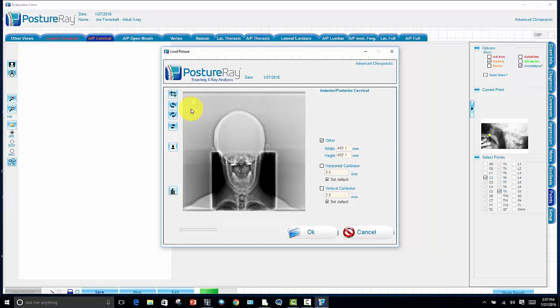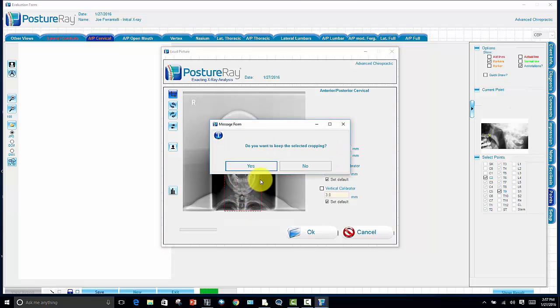There's more things to think of than what we were trained in chiropractic college, especially marketing and interpersonal relationships with medical providers and stimulating referrals. There's absolutely some good reasons why we're going to look at them like medical doctors here. So don't get confused. We can always flip out the x-rays when we put them into your EHR. When you save them out, you can be flipped back to the chiropractic view. But for the reports, we're going to want them this way, okay?